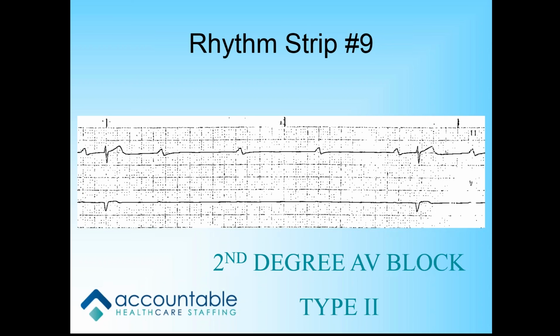Okay, Kristen, thank you. I have a quick question. This is Ellie, I'm sorry. I'm looking at the heart block poem, and it says if some P's don't get through, then you have the Mobitz II. But it's all P's here. Well, take a look. You're not looking at it incorrectly. If you look at the beginning of the strip, you have a complete PQRST, and at the end you have a complete PQRST. You've got 3 P waves without QRSs.